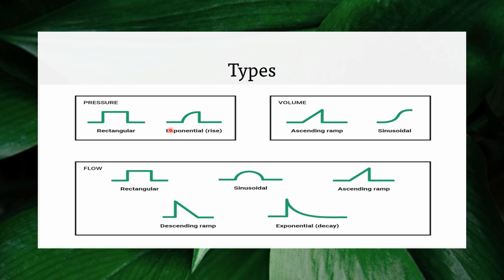Similarly you can see there is exponential rise. This is volume, you can see this is ascending ramp, this is sinusoidal, this is descending ramp pattern and this is exponential decay. Remember, shapes depend on mode of mechanical ventilation and patient's respiratory mechanics.